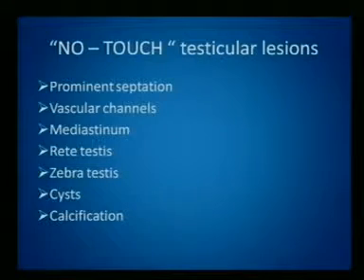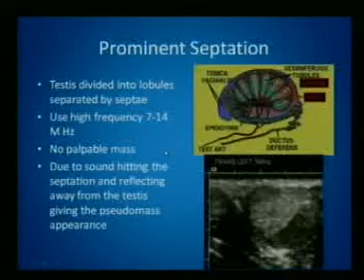When we do the ultrasound of the testicle, we have what we call no-touch testicular lesions, and these are simulating some pathology. We should be aware of these lesions, and I will discuss some of them.